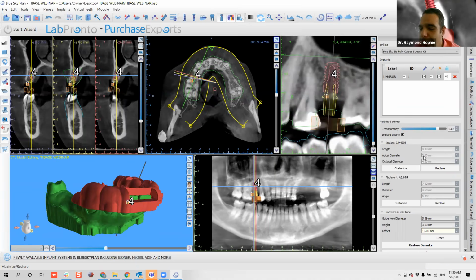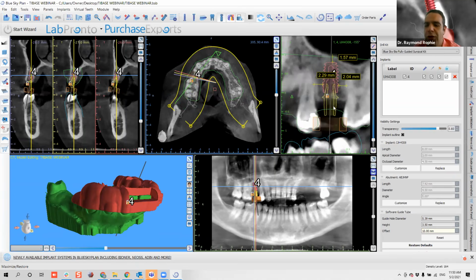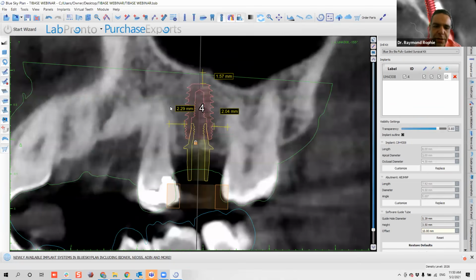I don't know where they are, but no worries. So what we're gonna do is I will use the measurement. Okay, here they are. Here are my limits. So I'll grab these notes. I can just change this here so I can know exactly what is each of these measurements.